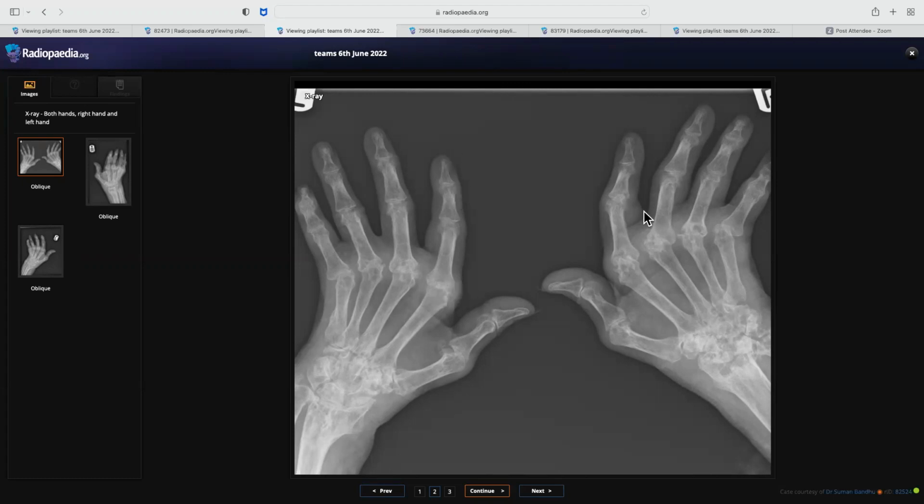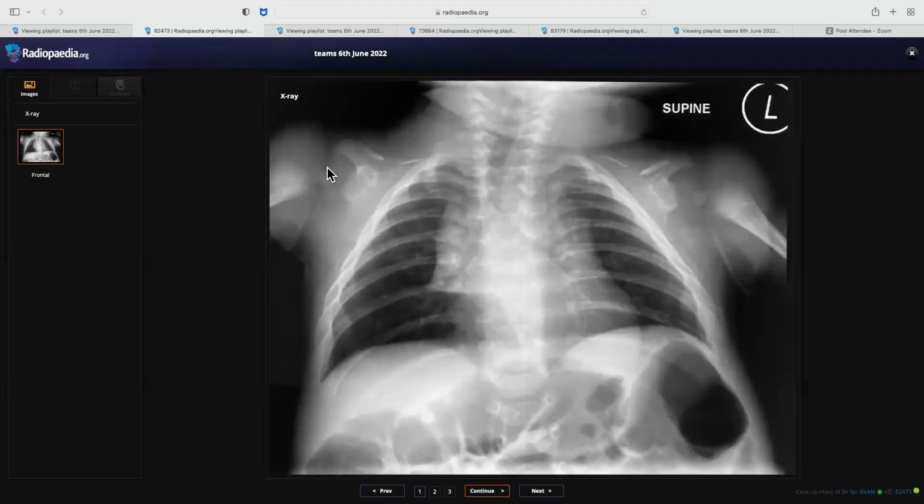Gout, I would think more in terms of overhanging edges, which I am not seeing here, and I would see soft tissue tophus in gout. Like that, you can tell and then exclude. Keep doing that alongside. That's not a problem because they can have overlapping features. This one, if you see it again, you don't see the clavicles.